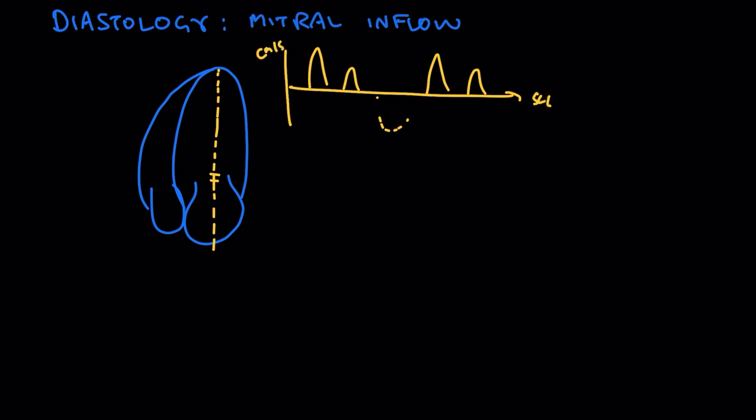Now, as you may guess, in atrial fibrillation, that atrial kick may be completely messed up, but we'll say that this patient is in normal sinus rhythm, and we're looking here at, this is diastole, when the heart is filling, and then somewhere around here is systole. And you may or may not see some mitral regurgitation during the systole. Okay, so what can we learn from the different patterns of mitral inflow?